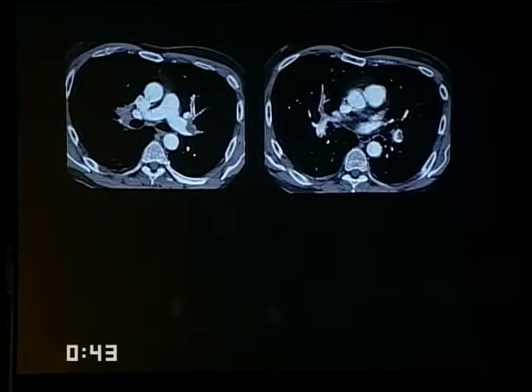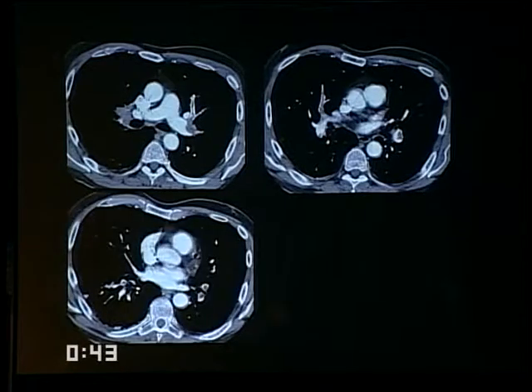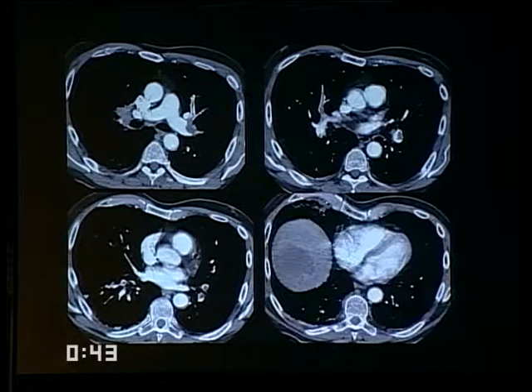Same thing here in the anterior segment of the right upper lobe and in the left descending pulmonary artery. And then more classical appearance as we get down into the lower lobe with multiple central emboli with contrast partially surrounding them. And this suggests an acute embolus. This patient also has metastatic disease in the liver.